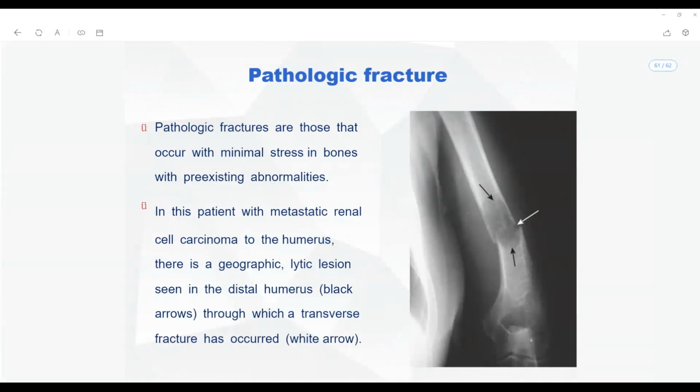Yes, can everybody see it? Okay, just try to look at the other image I have sent you. Okay, it is actually the wedge compression fractures.